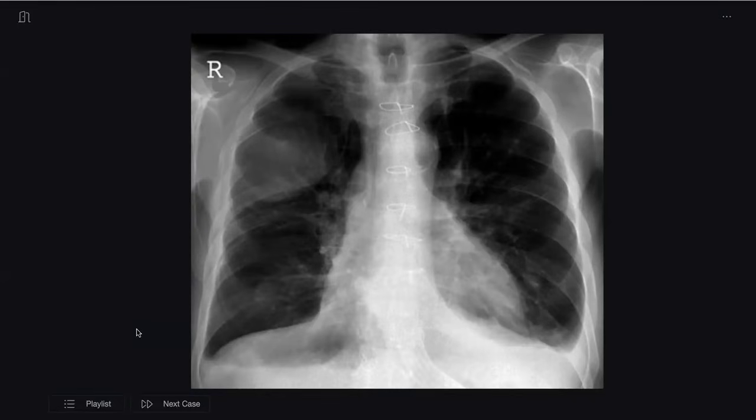Here I could appreciate that there is a stent noted in the inferior aspect of the film, at the edge of the film. Likely it is some kind of esophageal stent. If this is the case, then I'm suspecting these are metastatic nodules of an esophageal malignancy. Good, but you're missing a major finding here. You made the diagnosis, but missed something. Is there migration of the esophageal stent? No. What would you look at when you're suspecting metastasis?